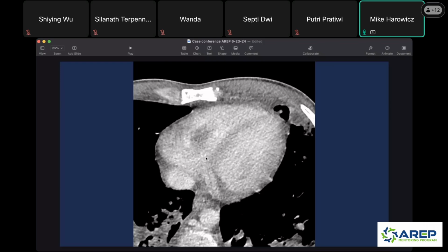It's in the region of the tricuspid valve, right? I don't know exactly where the tricuspid valve is, but if I had a guess, it's somewhere around here. And so that worries me that that's a vegetation, right? So this is how you can help your clinicians, right?